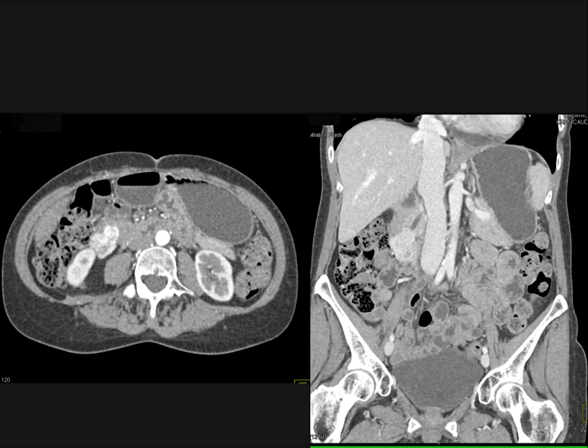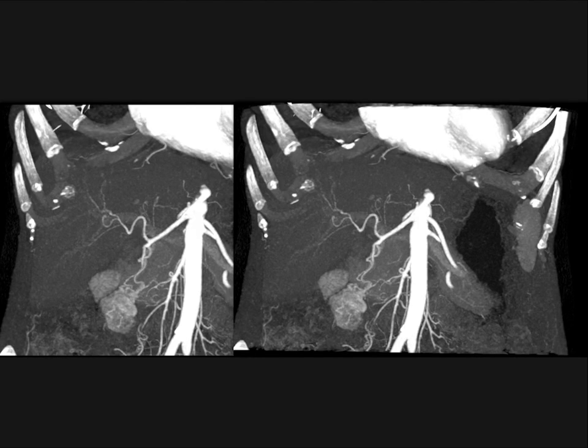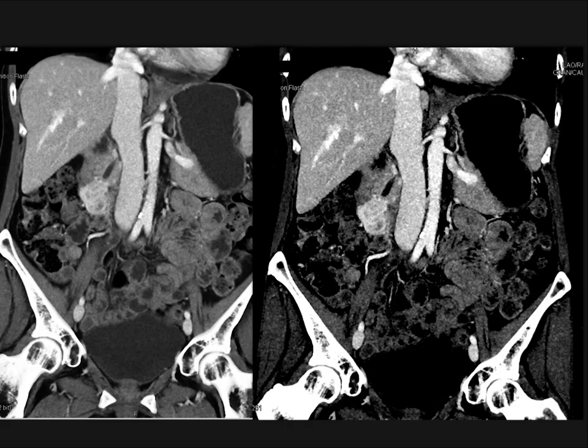And you see how these lesions are exophytic. You see how these lesions often have vascular supply. Look at those branch vessels off the GDA with the neovascularity. This is malignant. And here it is again. So you can see we're getting very good at detecting them because it's really technique. Fast injections. If I'm doing a rule out GIST tumor, I'm looking for small bowel tumor, I'm doing dual phase imaging because it's going to help me pick up many things.